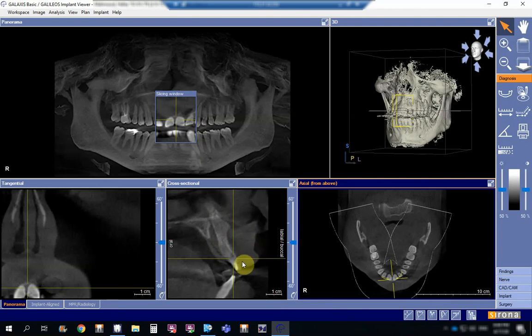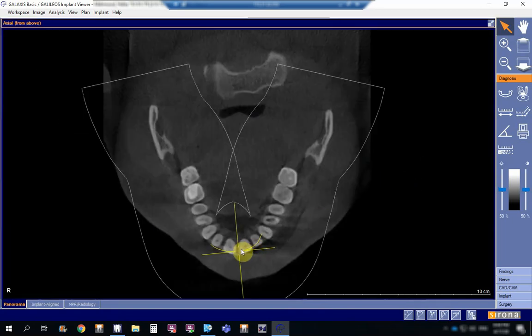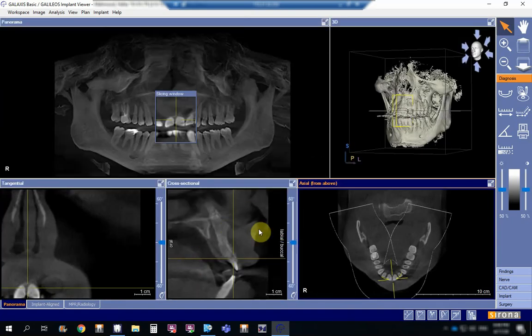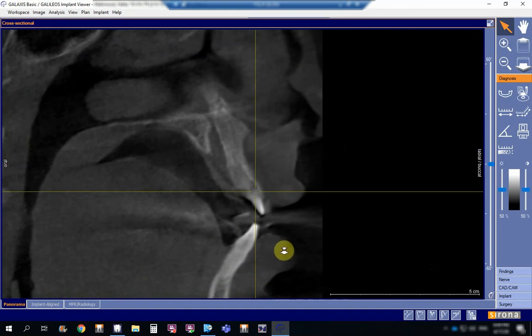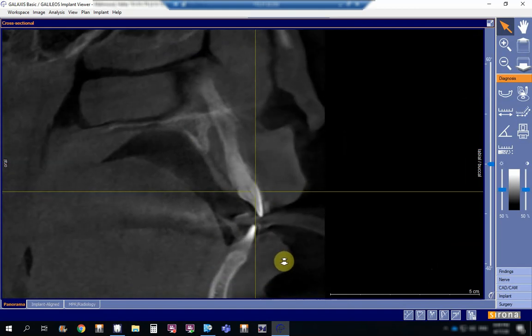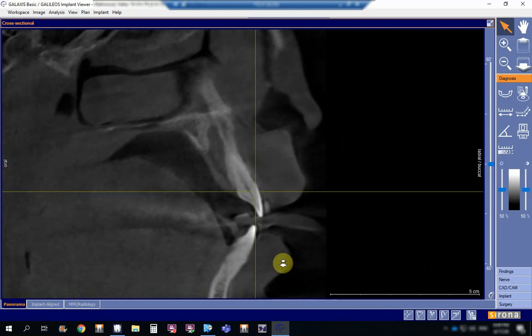You can see it, and what we're seeing in reality here is the mesial surface of this tooth. See, I will enlarge here. What we see here is the mesial surface, and when we navigate, actually we're going in this direction. Let me show, maybe in the first view it will not show as clear as it is, but let me see. This is the mesial surface of the central incisor. If I am navigating, this is the full thickness of the tooth, then I'm going distally.